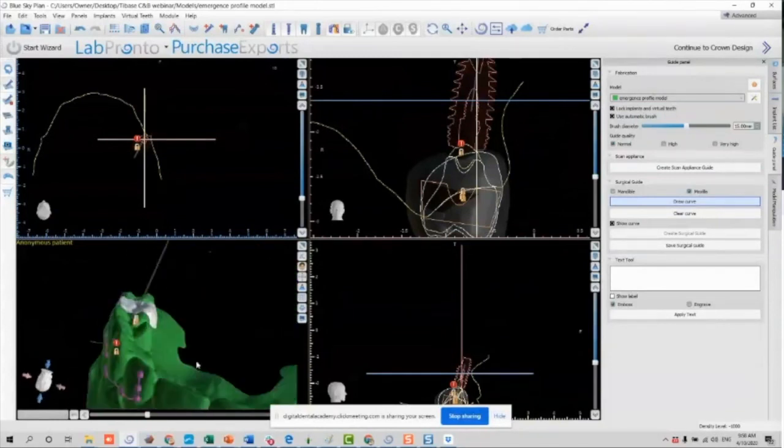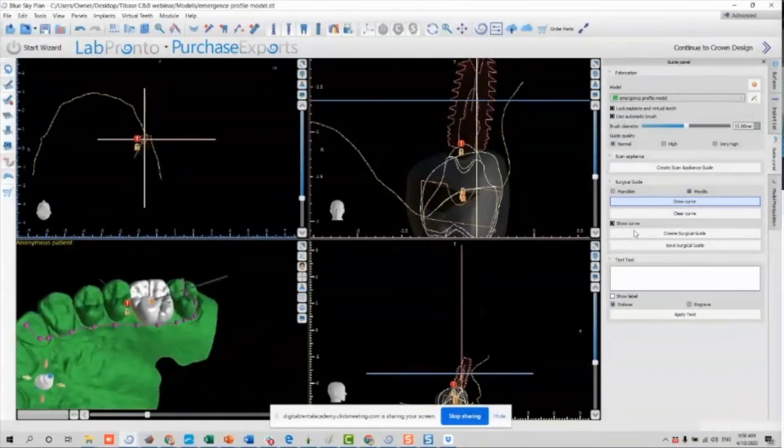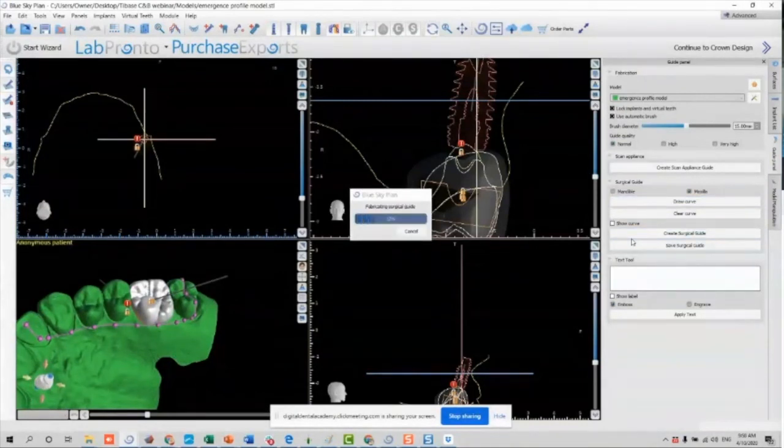This is just to recap again and to join this with yesterday's webinar. Okay, after you have your surgical guide created, you will deliver to your patient one temporary, one emergence profile, and one surgical guide. And this is what crown down guided surgery means.